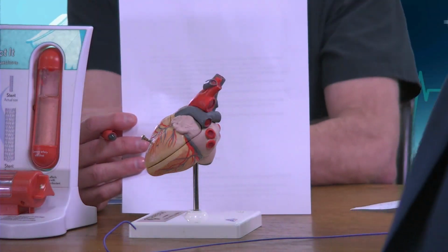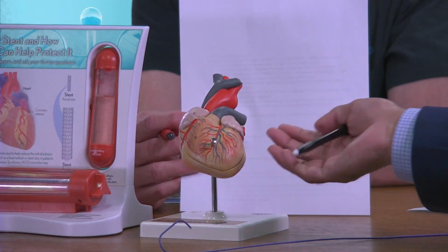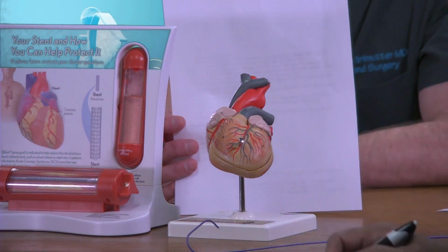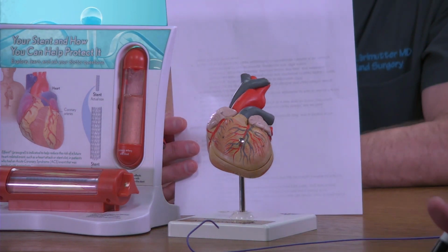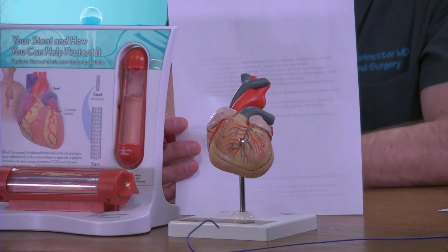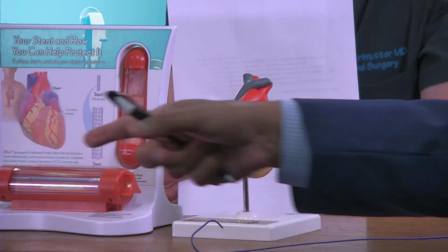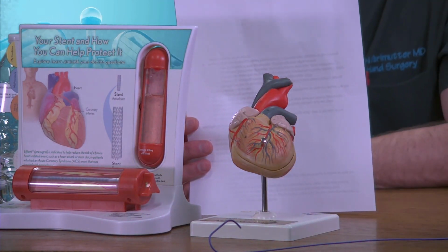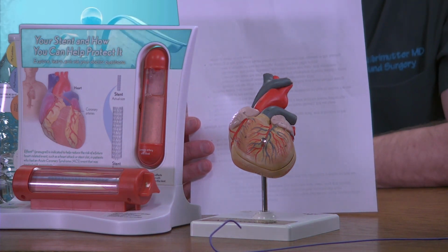So this is the stent, and this is the actual dimension of the heart. So that's a life-size heart. These are the arteries, the red ones, the blue ones are the veins, and when the arteries get clogged up, the heart doesn't get blood supply. They either have a STEMI or blocked arteries suddenly, and in this case, the patient would have stable angina. They exert and they get tightness, heaviness, shortness of breath. Pain with exercise, that's called stable angina.